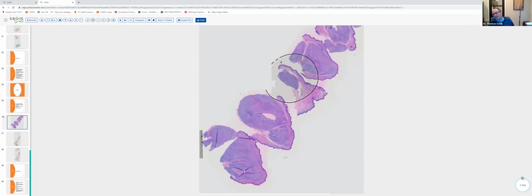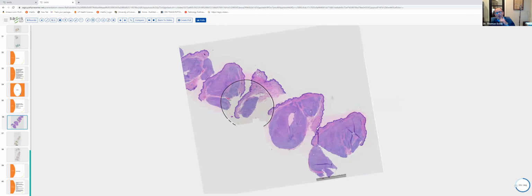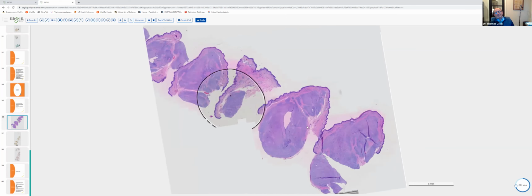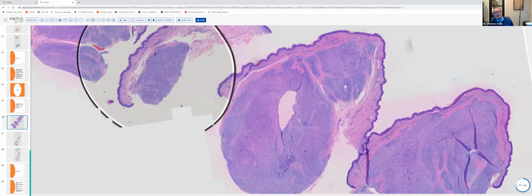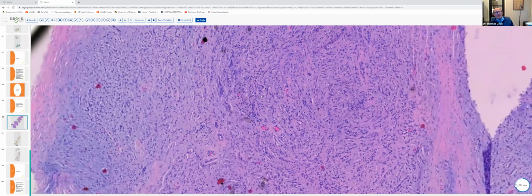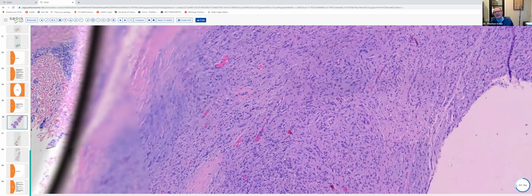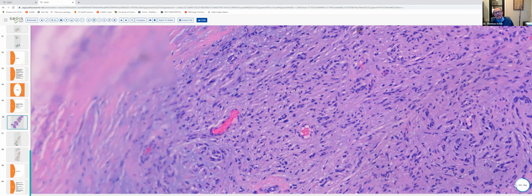And in these particular sections, you can see that we've got a slightly pedunculated papule here. Within the dermis, there is a neoplasm which is vertically oriented and fairly sharply circumscribed, kind of has a pretty characteristic benign silhouette. And if we move to higher power, what we see are these lobules and kind of small nested aggregates of uniform spindled cells. Many of these have very elongated cytoplasmic or nuclear processes tapered on both ends.